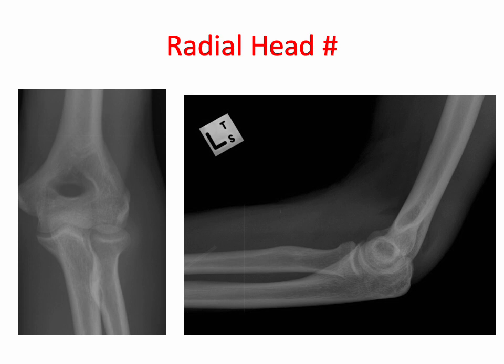Another example of a radial head fracture, which is not particularly easy to appreciate on either the frontal or the lateral projections, but again we're seeing elevated anterior and posterior fat pads with a sail sign of the anterior fat pad. We look here, we'd be suspicious that there's a fracture of the radial head here.